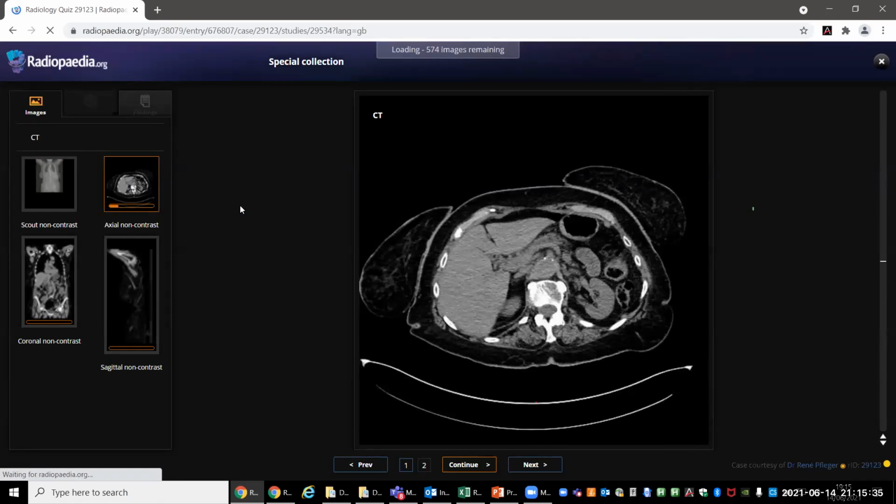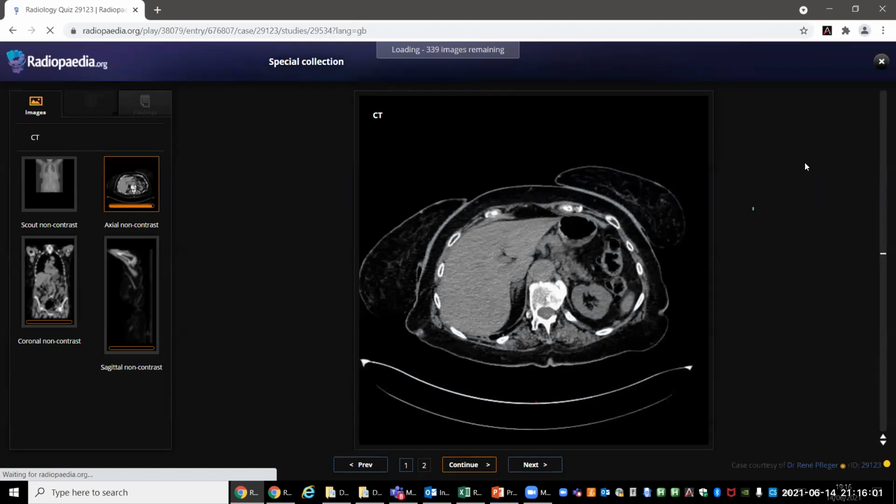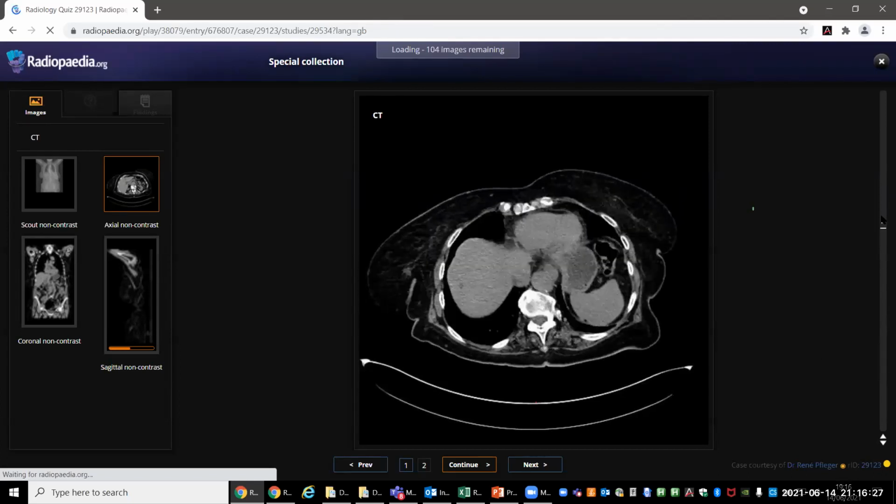Okay, so you have to scroll through these images. Take your time, scroll through before you start talking. Okay, ma'am. Not able to scroll through, ma'am. Please, if you can. Okay, I'm so sorry. So let me just start from the beginning. Okay.